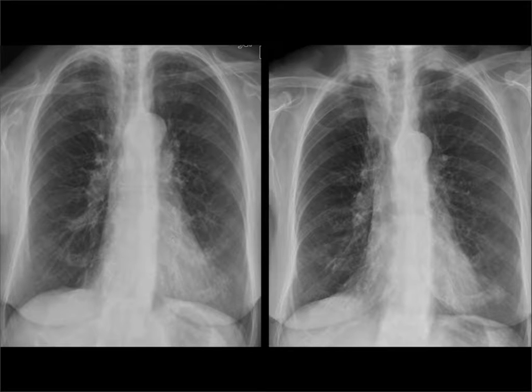Here's a patient who has had previously treated right apical lung cancer. It was treated with radiotherapy. You can see some scarring here and some elevation of the right hilum here. This is the baseline, and then this is a follow-up 6 months later. And what you can see here is now there's thickening of the right paratracheal stripe, and this was due to recurrent adenopathy from recurrent malignancy at this site.